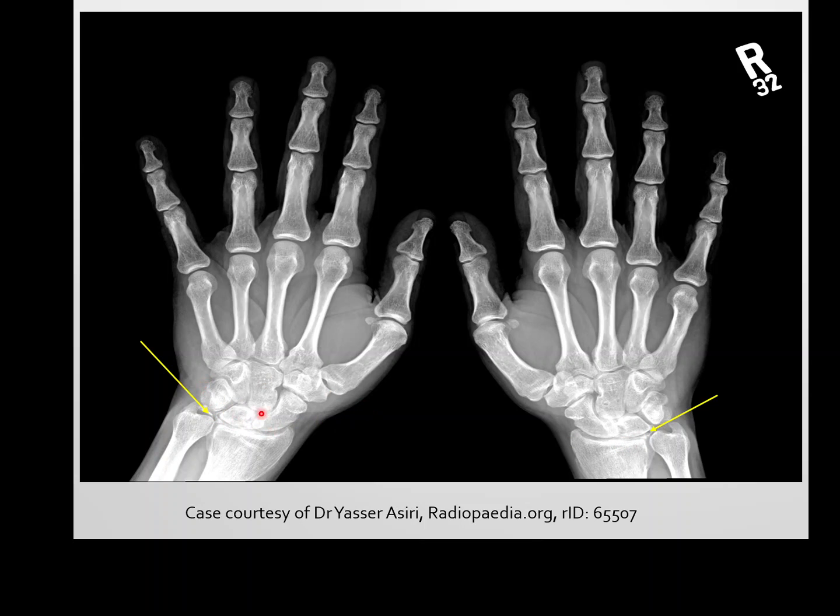In this patient as well, there's very little else going on. There's no signs of any real swelling. The soft tissues don't appear to have too much swelling going on, as well as there's no joint effusion, and there's no superimposed degenerative changes either. There's no bone spurring, there's no subchondral cysts or sclerosis going on. So it looks as though it's a very, very subtle sign on the distal radius.